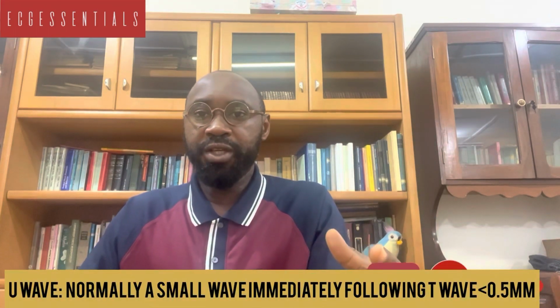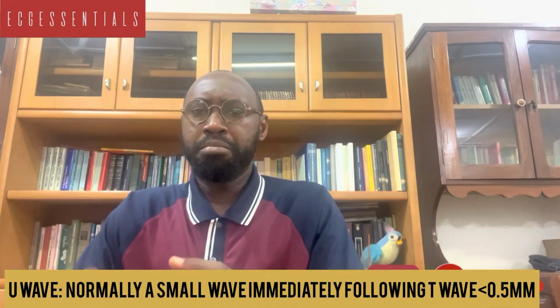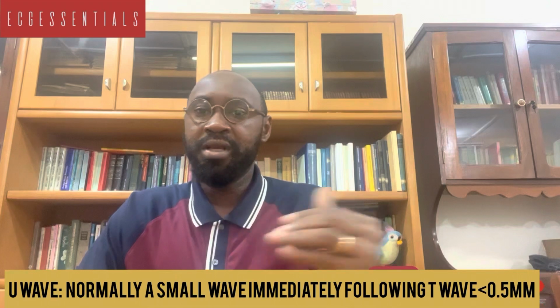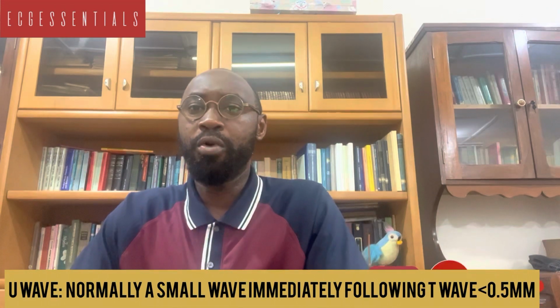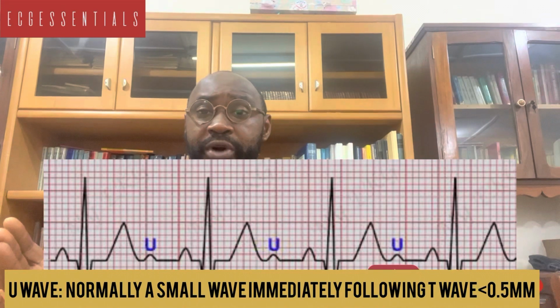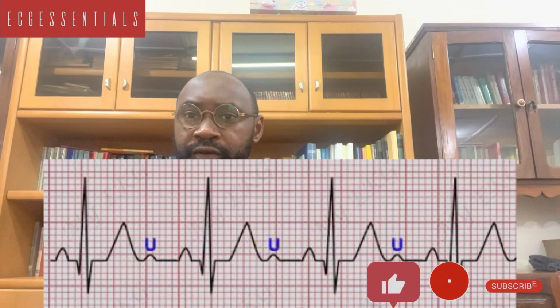And with that, we'll start with the U wave. The U wave is a small deflection immediately following the T wave. Usually it's less than 0.5 millimeters, that's even half one small square. And these U waves, if they are present, are usually expected to be in the same direction as the T wave.